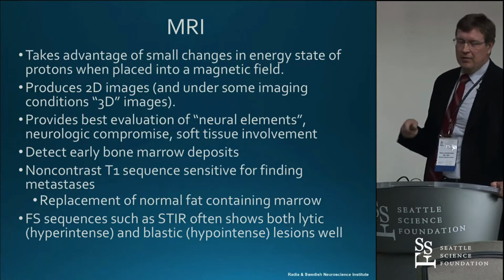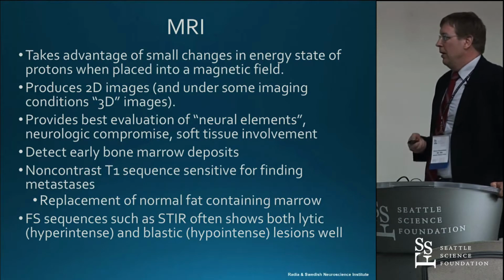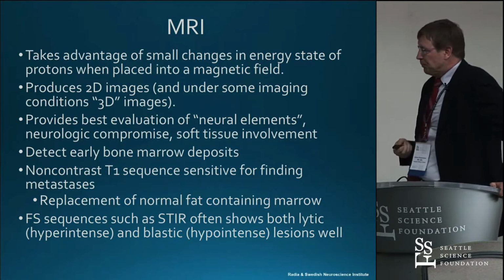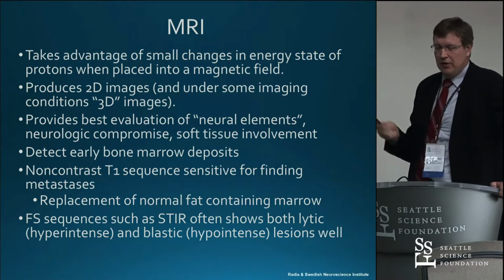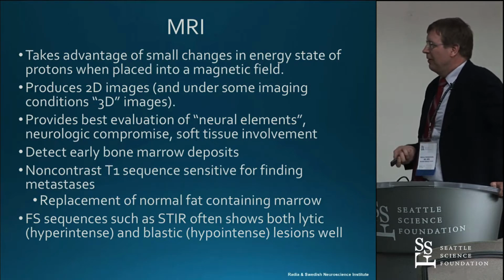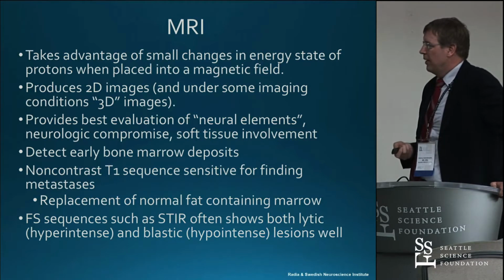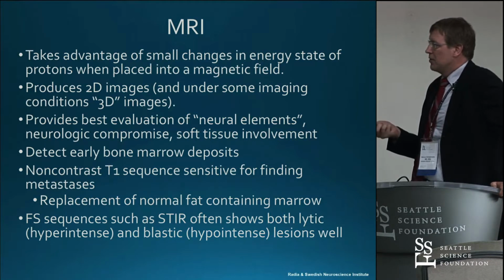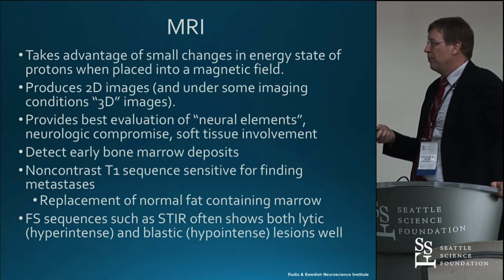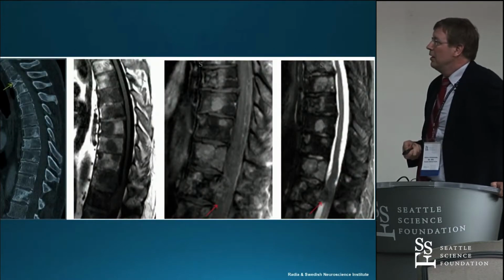So for example, noncontrast T1, which is kind of the bread and butter sequence, we would see these dark areas, what we call black balls of death. Often that's how mets manifest. There are also other sequences like a fat-saturated STIR sequence, very good for showing both lytic and blastic lesions.